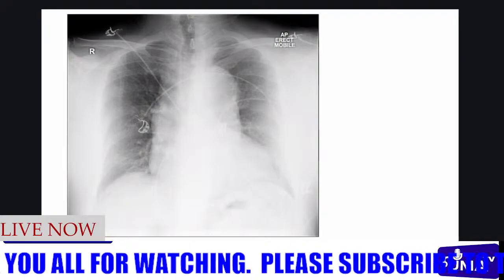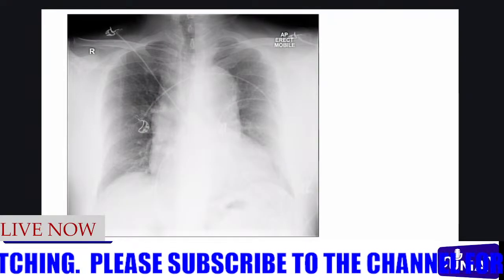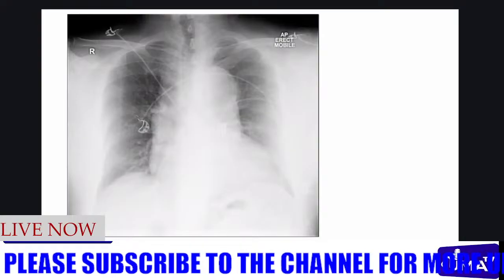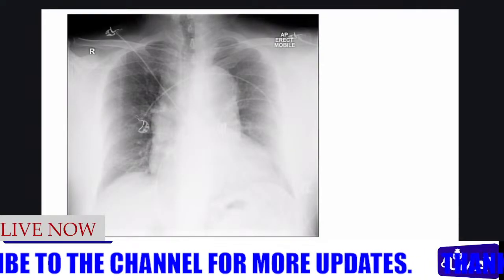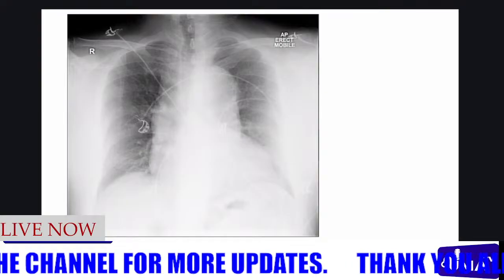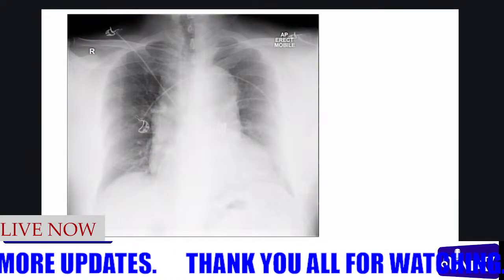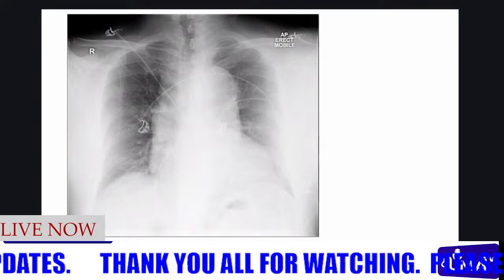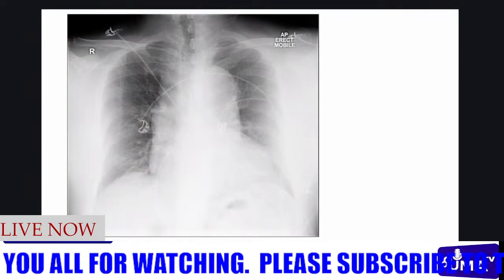The patient will go to a health center where they can do a chest X-ray. As a clinician, you should be able to tell that a patient who has this severe tearing chest pain and has this X-ray, I don't know if it's clear, you should be able to say, no, I don't send this patient home with painkillers.